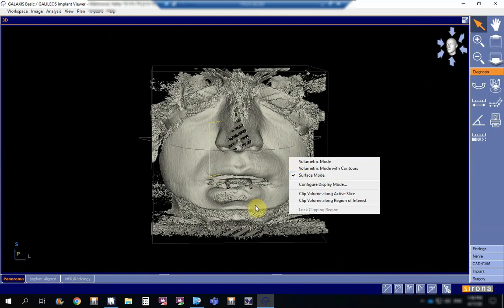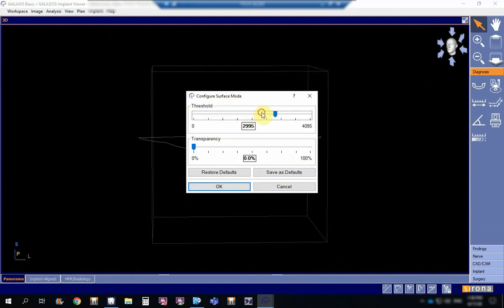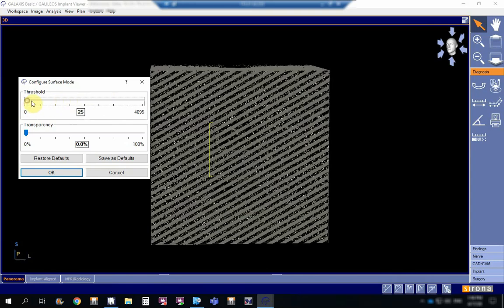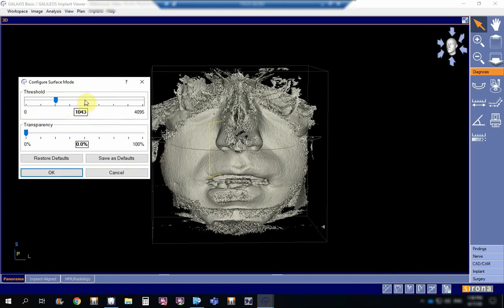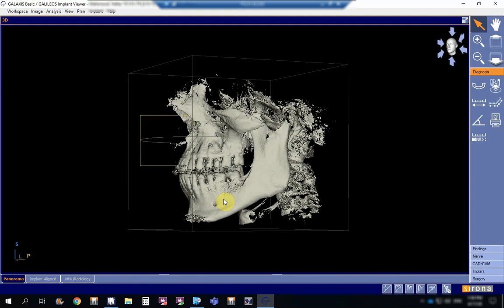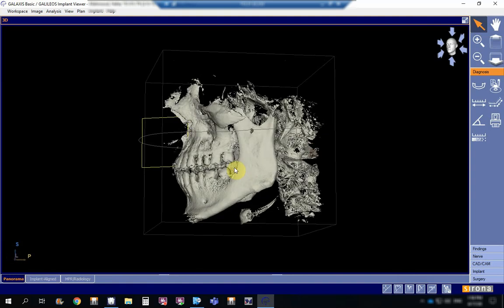It will only show the patient or the view from the frontal sinus downwards to the chin of the patient, as you can see in here. And this is the maximum coverage of this X-ray. This is the vertebral column, okay. So you will see it all.